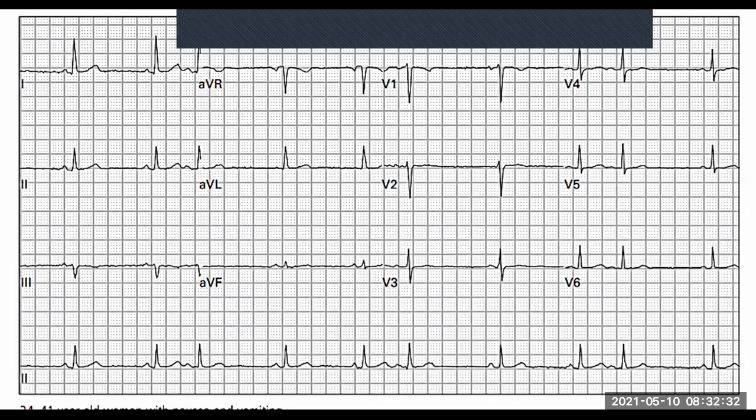If you look at this one, it's nice and peaked. And if you look at this one, it's got a quick upslope and then a long downslope. Then if we go to, let's say, this one, again this one is peaked. And this one has this weird slope, comes down. This one looks normal. Then you get an abnormal one, another abnormal one. And then we see those lines in between. So there's something wrong. Our P waves are not normal.